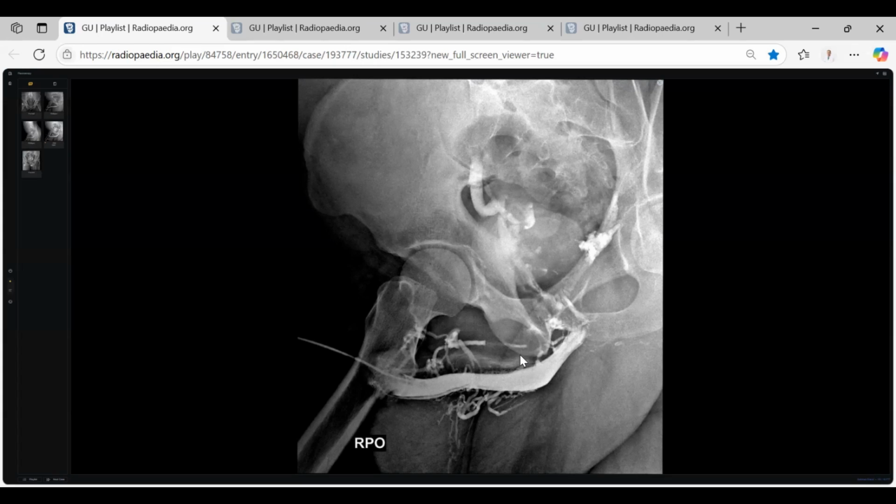I didn't hear you well. Where does the contrast go? Sir, I think it's going in some vessels, maybe. Yes, can you hear me? Excellent. Sir, what is the name of this process? When you inject the contrast under pressure, what will happen? Contrast intravasation within the vessels. Excellent.